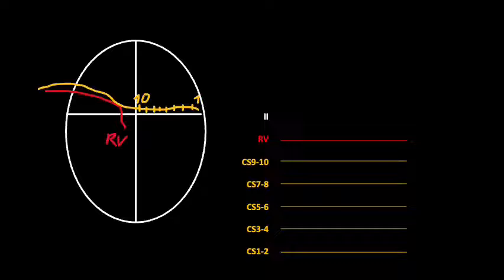So just to remind you, in case of the right ventricular pacing, if there is a pacing artifact and when we've got the left-sided accessory pathway, typically in the catheter located in coronary sinus, we should register eccentric activation of the atria. So the earliest activation should be in the distal parts, distal electrodes from CS catheter. And in this case, there are no doubts that we've got the patient with the left-sided accessory pathway.